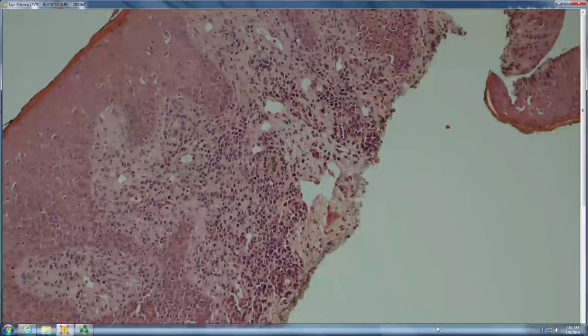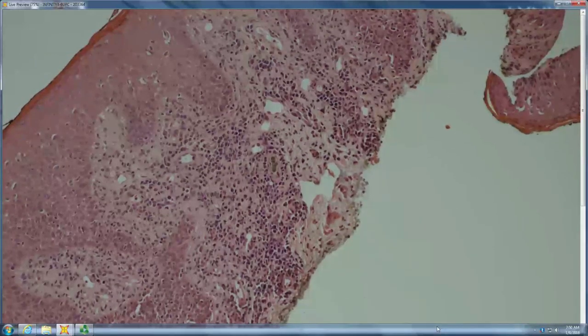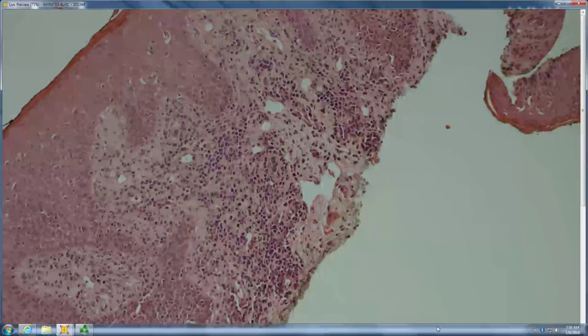So chancroid looks a lot like chancre histologically because it's a genital ulcer, and anogenital skin, when it gets inflamed, is going to have lots of plasma cells. But syphilis takes its plasma cells with it from the mucous membrane wherever it goes. Early KS has plasma cells. One of the ways residents said they remember that is it's trying to tell you, I was acquired on a mucous membrane and now I'm taking my plasma cells with me.